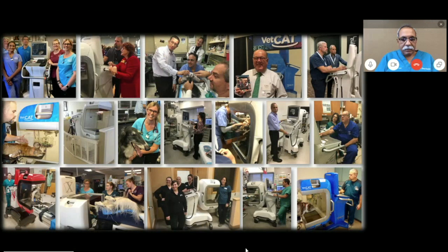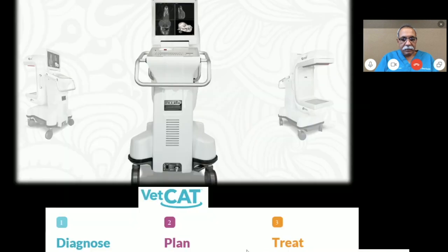There's a number of users around the country. We have now hundreds of cases, a lot of dental use of the machine, but Dr. Kureshi focuses on ear anatomy in particular, a disease that we see quite a bit on patients who come to the dental office as well. So we'll be focusing on that a little bit. So that's the VetCAT. It allows you to diagnose, plan, and treat relatively quickly.